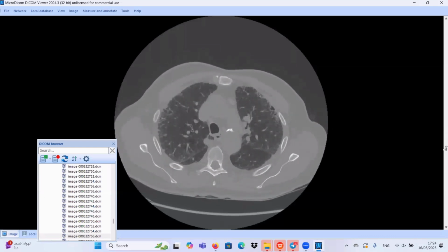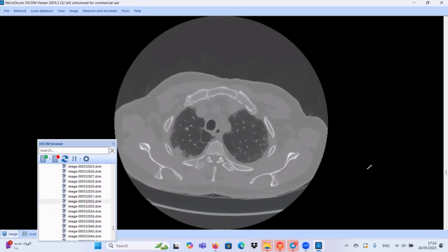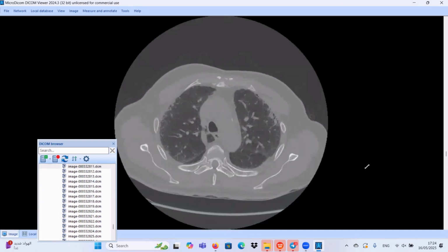Once we have something like this, you should search for any primary lesion. We have here subpleural soft tissue lesion at the apical segment of the right upper lung lobe. I don't know, is it primary or not, but you should comment and you should put it in your report. Maybe this is primary adenocarcinoma, peripheral adenocarcinoma, maybe pulmonary nodules as well, maybe area of consolidative changes. I don't know really, because this one is very small and non-specific, but needs clear follow-up.